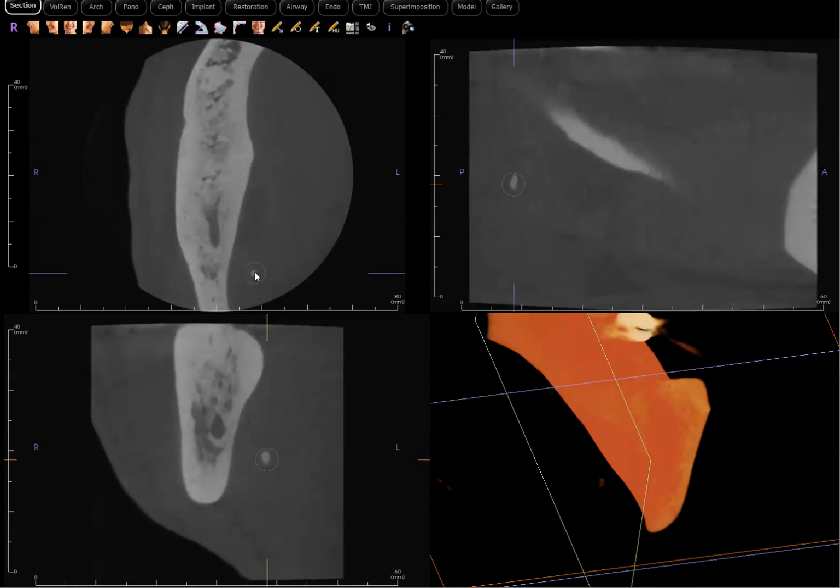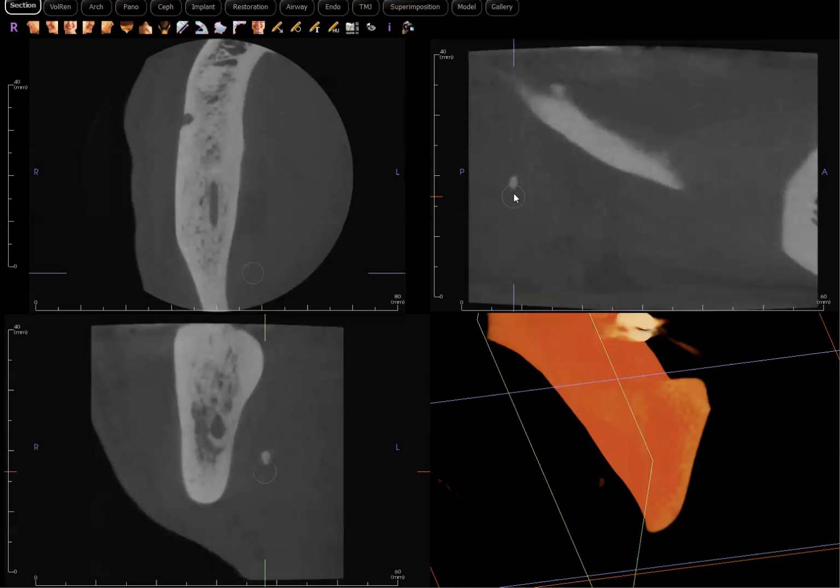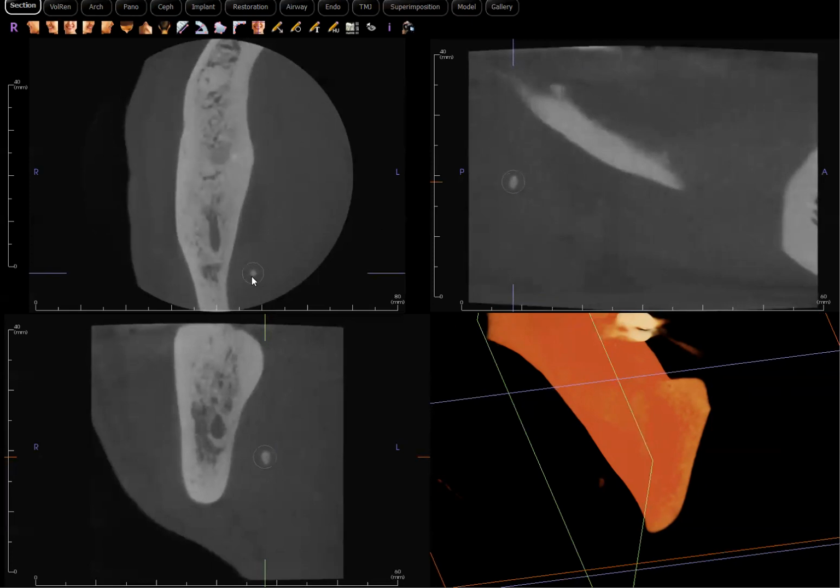So now, do I know for sure whether this is in the gland or the duct, the Wharton's duct associated with this submandibular gland? I don't know for sure, right? Because again, I don't have that soft tissue contrast. But nevertheless, it is small and I doubt that the patient is symptomatic. The doctor was unaware of the pre-existing sialolith. But it's still important for me to catch something like this and bring it up to the referring doctor to correlate with any discomfort during mealtime.